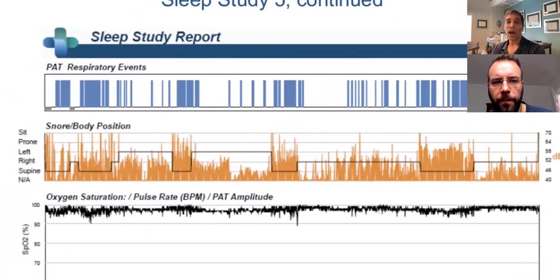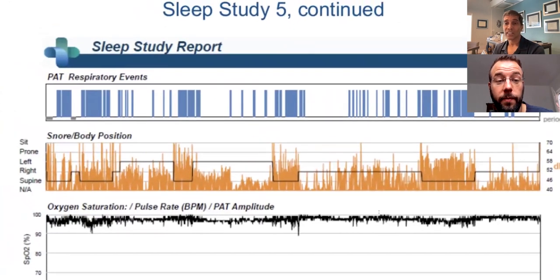You can see that, wow, tons and tons of snoring. Chain snoring. This is the freight train snoring, right? All through the night and loud. But surprisingly, doesn't move all that much, not entirely that kinetic of sleep. Does that make sense? Because you do change positions here and there.